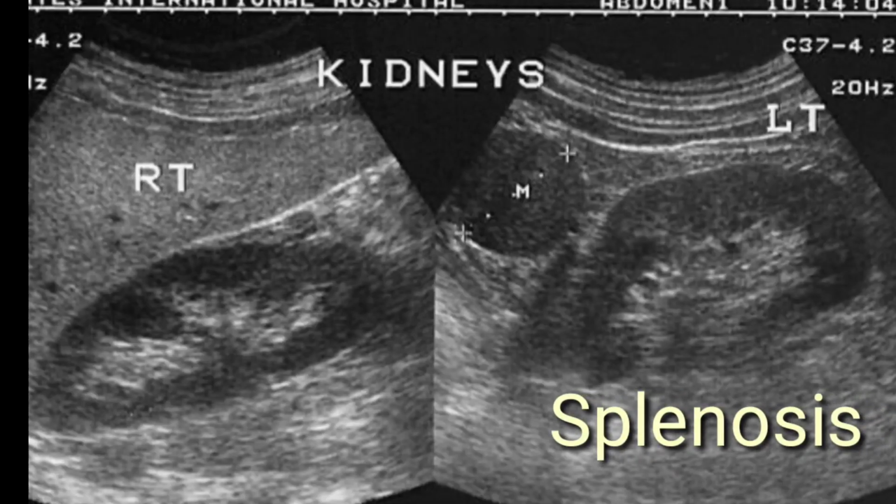After trauma or rupture of the spleen, splenic tissue may auto-transplant and appear the way you are seeing in this image. This is called splenosis. On the right side image, the normal spleen and normal left kidney are visible, while on the left side a round nodule is seen. This is actually splenosis. This is not a mass. This is spleen tissue. After rupture, this is auto-implanted here and this is called splenosis. So there will be a history of trauma or rupture of the spleen.